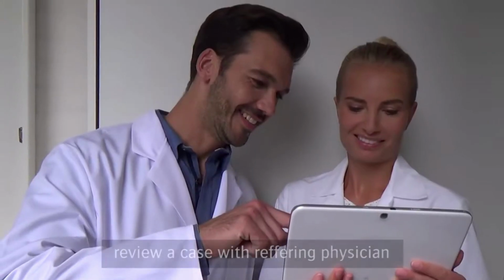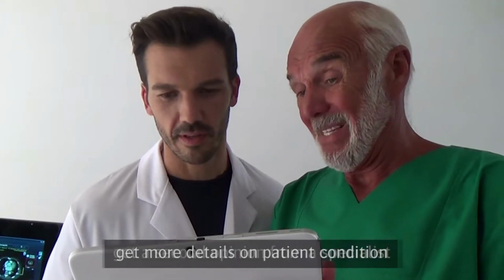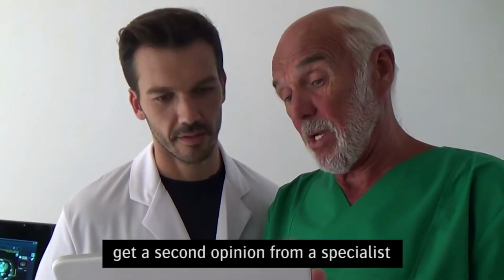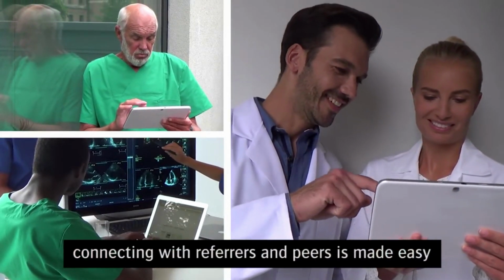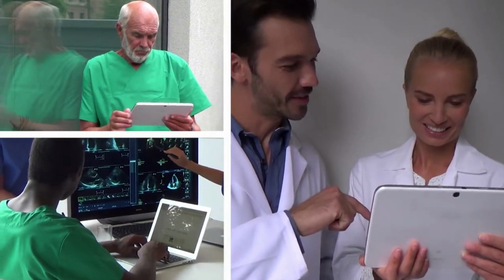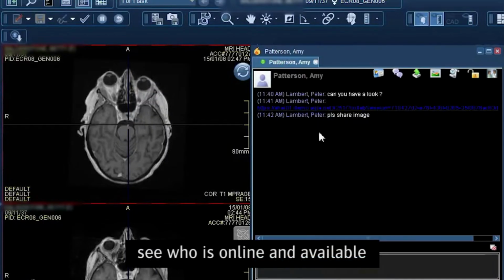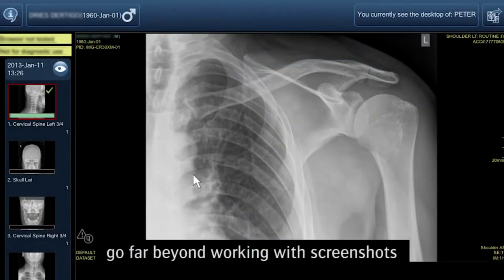When you want to review a case with the referring physician, get more details on the patient's condition, or get a second opinion on a difficult case from a specialist, how do you reach out? Connecting with referrers and peers is made easy with AGFA Healthcare's Enterprise Imaging for Radiology. See in a glance who is online and available so you can broadcast a question or ask it via chat. And go far beyond working with screenshots.